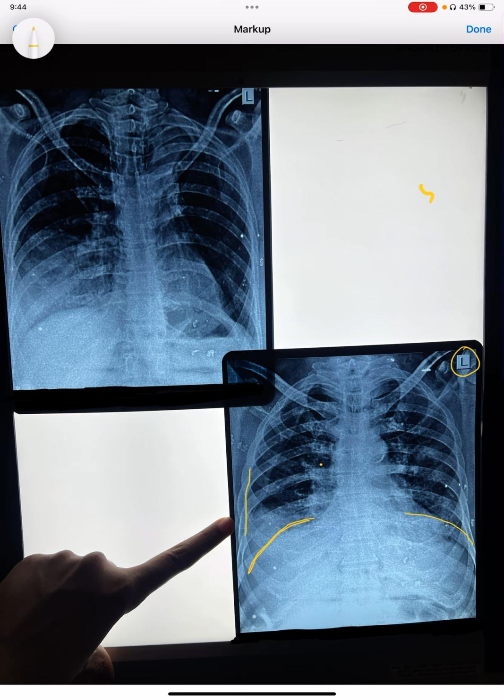So, there is bilateral effusion, meaning both costophrenic angles are almost blocked. Here all the angle is blocked, meaning effusion is for sure. Angle is blocked. So in this X-ray, this angle looks a bit clear, so there is no left pleural effusion. But in here, there is haziness. So there is a minimal effusion in the left pleural area, whereas on the right there is pretty good pleural effusion.